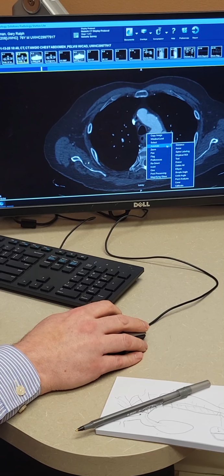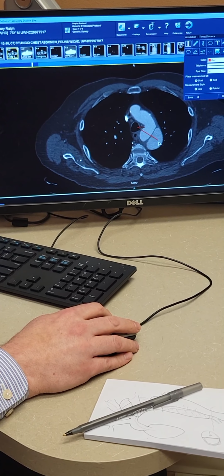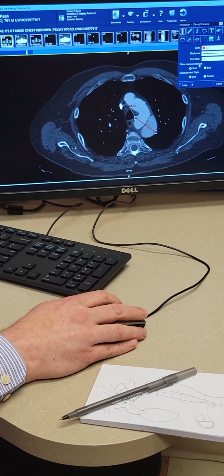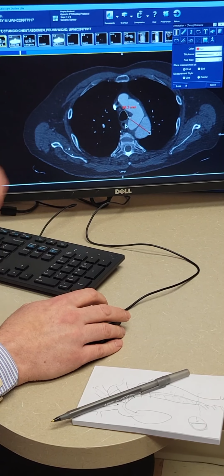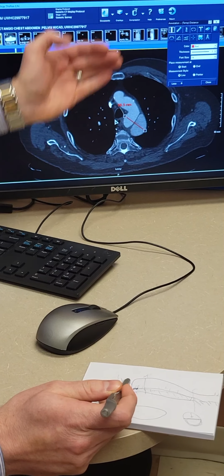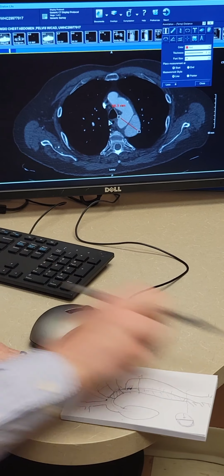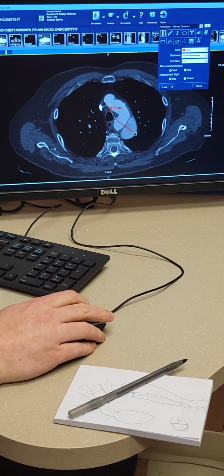And this is the area where we most often see growth because the blood has to turn. And so I know that's a little hard to read. But that's 5.83. They measured 5.9. I probably don't have it exactly right. But this, because the blood is coming up and then has to turn and go down, the forces are directed that way, but the blood has to then go that way. And so that's why we see the most growth in this area.